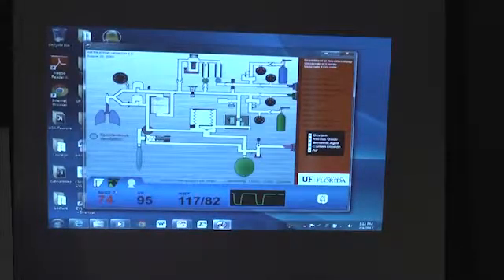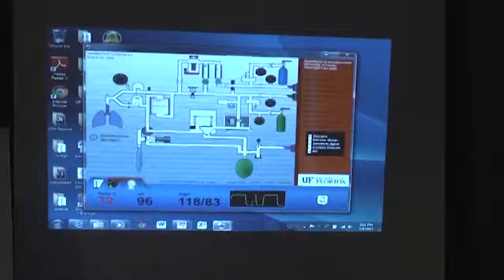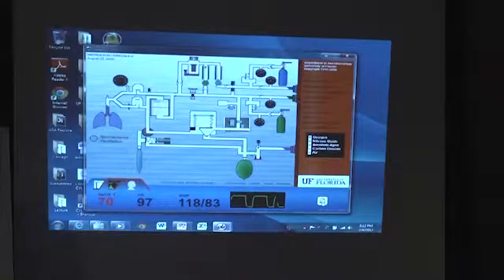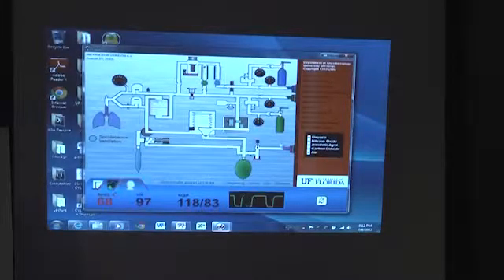Now, for the purposes of learning about the machine, clearly you want to take the patient off the machine, use the Ambu bag, and call for help. But for the purposes of this exercise, we want to keep on with this to the bitter end. So how are we going to troubleshoot it? Open the oxygen cylinder. Remove the pipe from the wall. Okay, very good.